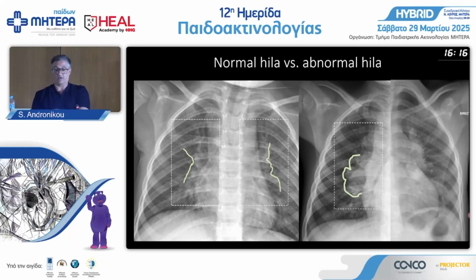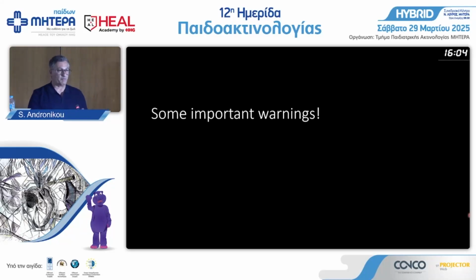And if you look at the second case, which was not so obvious, again, if it's bulging outwards, you may have lymphadenopathy. I'm not sure if we were accurate there or not. Okay? Okay, so some important warnings.